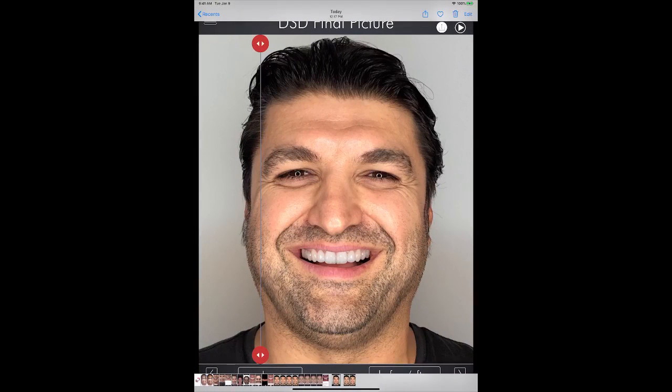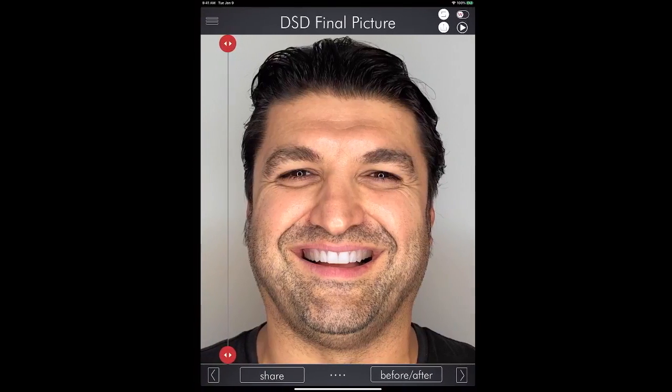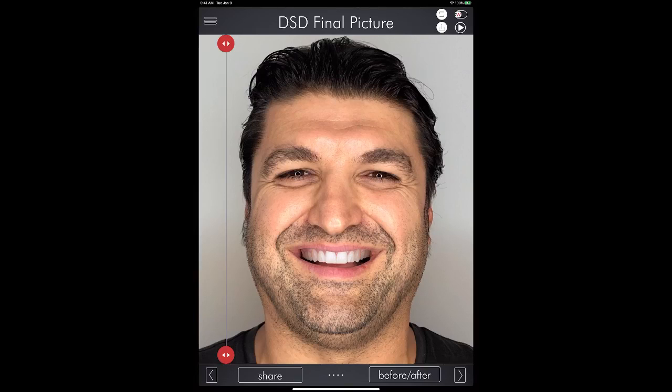Version number 1, we have Giacalini as a smile donator, right? And you see we have the round edges, these very beautiful templates. And then I need to decide, I'm gonna go with round templates, or I'm gonna go with the edgy smile with the Ricardo Brito smile.